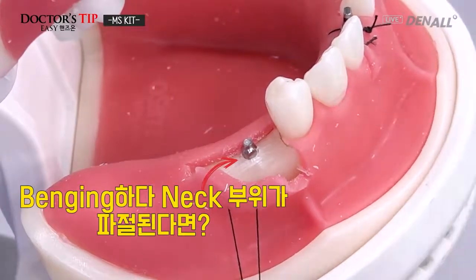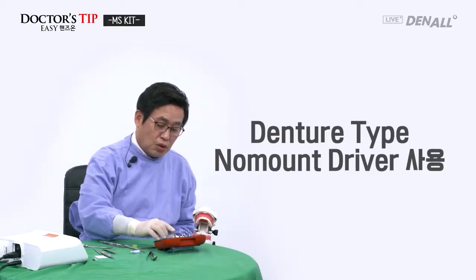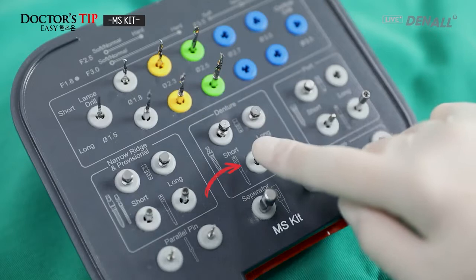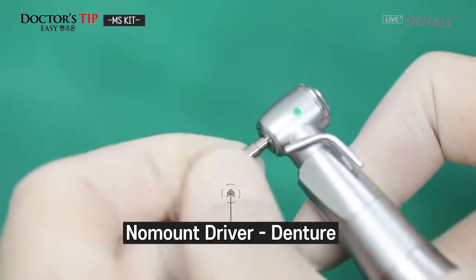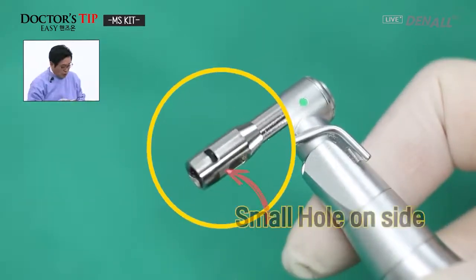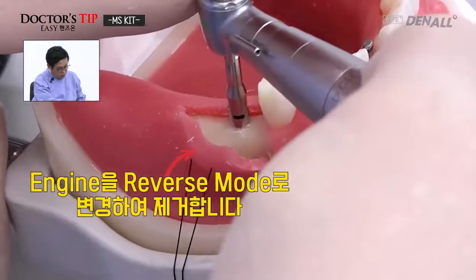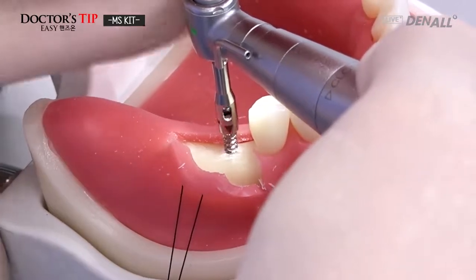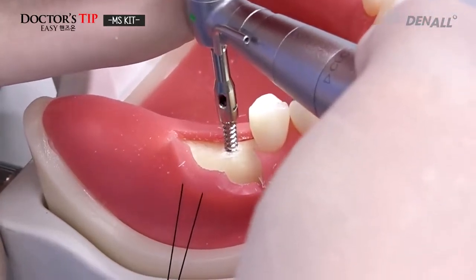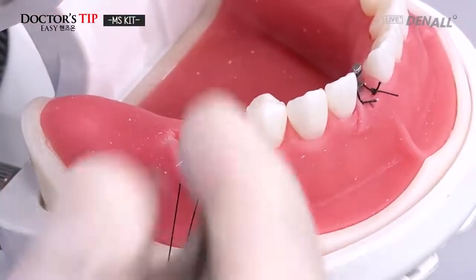But if bending results in such a fracture, then you have the denture type fixture driver, the no mount driver. For a denture, you can use this. You connect it, and you have a hexagonal rod on the provisional bottom side, so you push this in the reverse mode, then it can be easily removed. So while using a provisional, if there is a fracture, then using this denture type, you can easily remove the fixture.